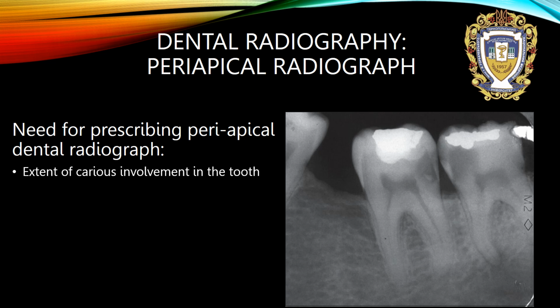As you can see, the caries lesions, decay of teeth, and I am sure that this tooth and this tooth have not only caries but pulpitis too.